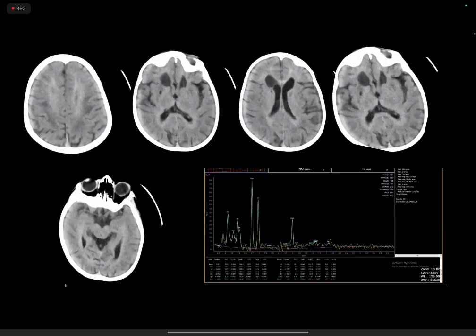On the CT scan, you can see again cystic lesions, no calcifications. I'm not sure if it projects out clearly, but you can see the periventricular abnormality is slightly more hyperdense. Some rim-like hyperdensity along the periventricular regions on the non-contrast CT. Spectroscopy was done in the basal ganglia and the white matter changes did not demonstrate any significant abnormalities. No significant lactate peak.